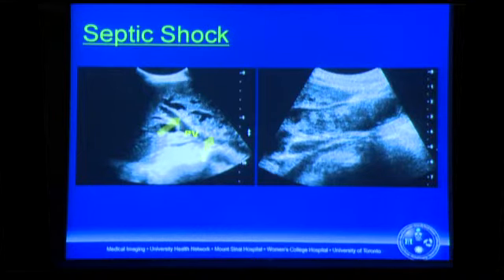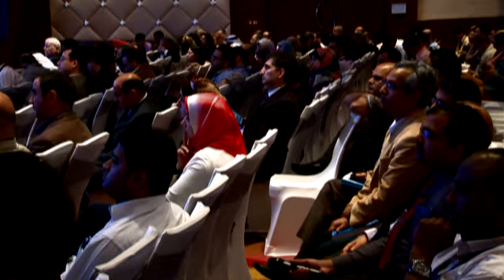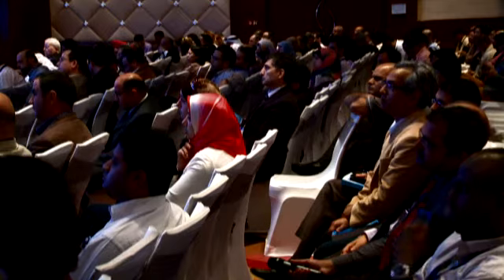And then immediately in front, of course, we see the right intrahepatic bile duct and the upper common bile duct massively dilated, and then we see material within those ducts, sludge and stones. This is a better image of the common bile duct more distally.